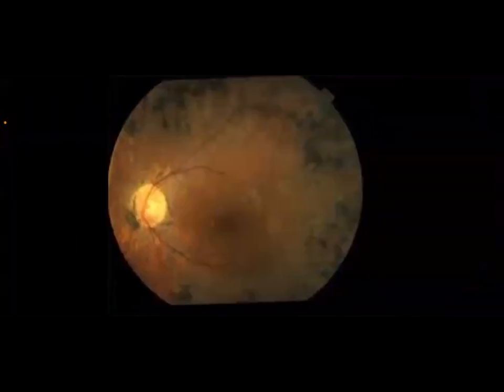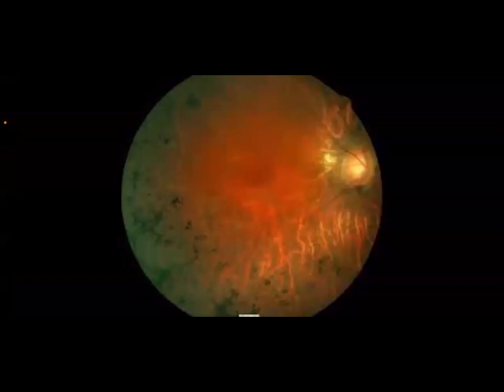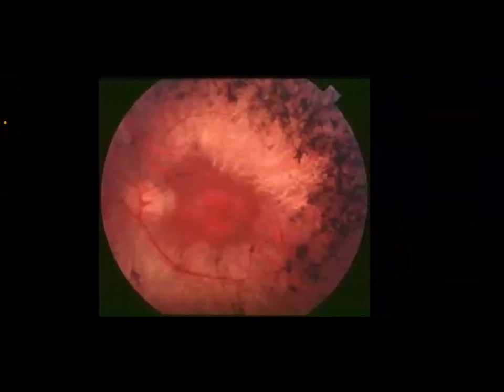If you can see the difference, it is not the well-organized, round, small laser burns. Are you able to see the difference clearly between laser burns and retinitis pigmentosa? Yes. This is again retinitis pigmentosa. Dark black bony spicules scattered throughout the peripheral retina. The patient will have two problems: restriction of peripheral field of vision and a problem with his night vision also. Again retinitis pigmentosa, dark bony spicules scattered throughout the peripheral retina.